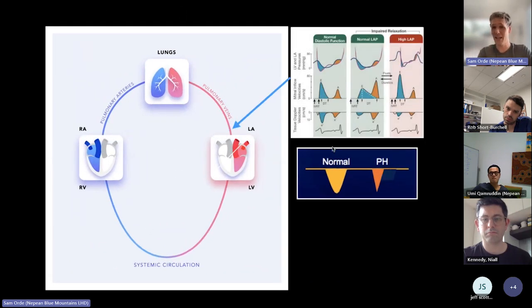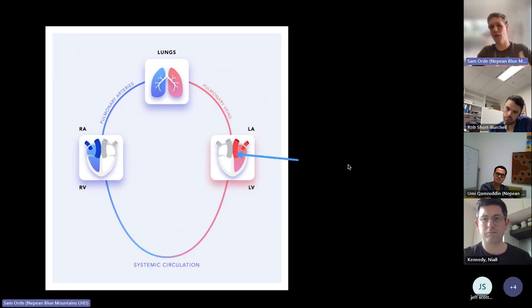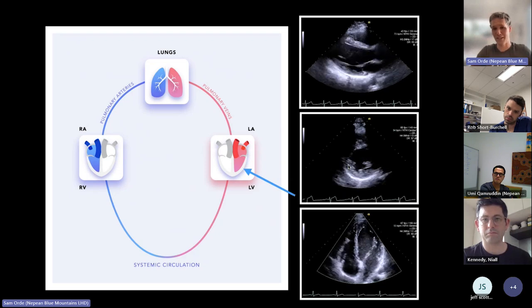Because on the other side, it looks more like it's got a parabolic shape. You don't get that systolic notching. So you get more of this reduced pulmonary acceleration time, but you lose that notching. And this is where you have to start trying to assess whether you've got raised left atrial pressure or not. And that's also got to be linked in then with LV systolic function.